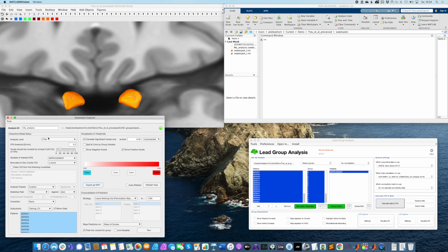We have seen how this tool can be used just to explore the data, and that we can look at the data on different levels, and we refer to the manual for more details for that. But now all of the three tools that I'm showing you will do statistical testing by means of bootstrapping.